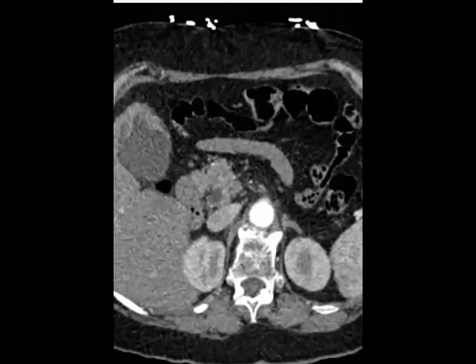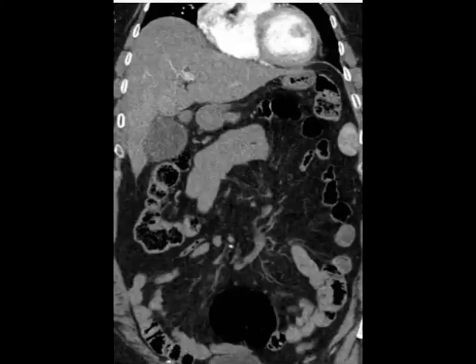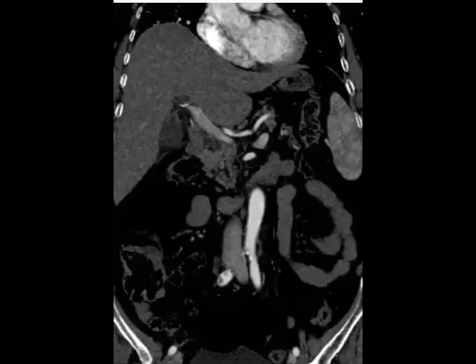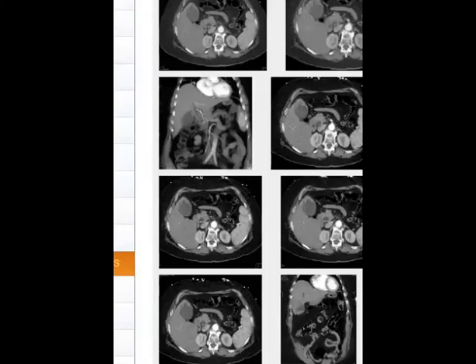So what is the top differential? Is it carcinoma or just cholecystitis with this appearance like a mass? Yeah, but with this appearance of very high uptake that involves all the gallbladder, then carcinoma will be the top differential in this case. Do you agree with me now?